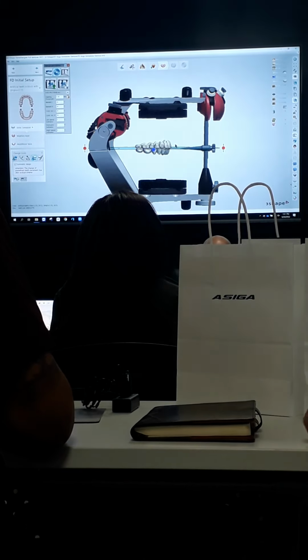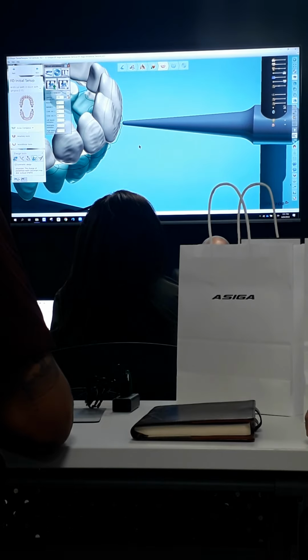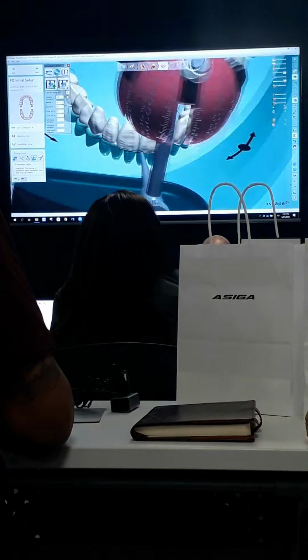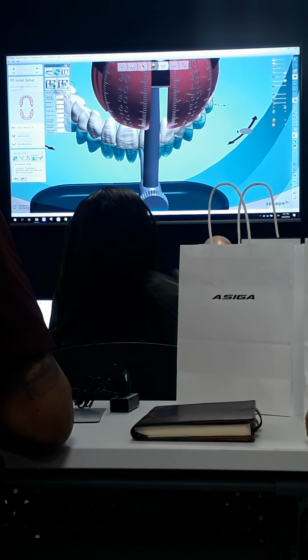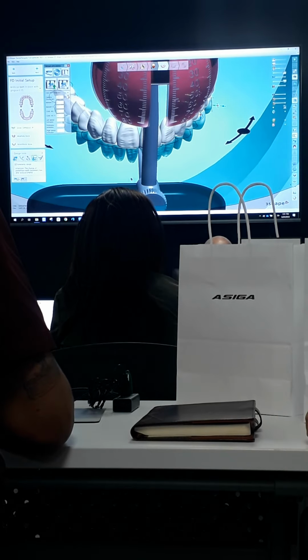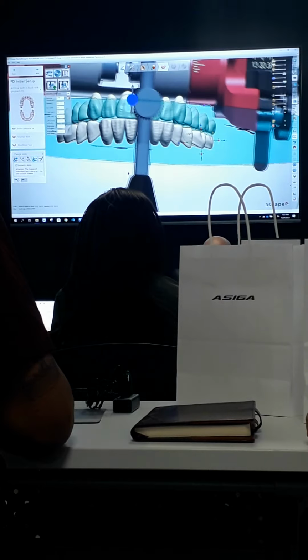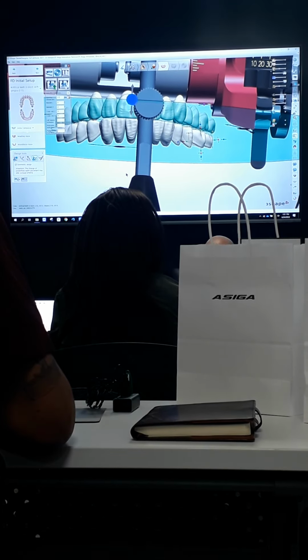But I'm going to go ahead and make sure that I'm positioned, just like if I were mounting this case. So I want to make sure that I'm positioned along this plane. Think of this as like a mounting table. So I want to make sure that I get it as close as possible. Now, if you were using that Ivoclar add-on module that I mentioned with that face bow, you wouldn't have to do this. It would already be positioned just like how it was mounted.